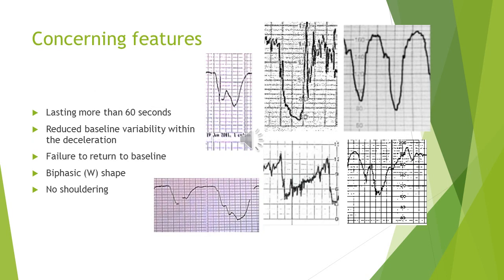We spoke about the variable deceleration, or the V shape, and we said they are either typical or atypical, or concerning and non-concerning features. So what are the concerning features? When should I worry when I have a V? Because before, the Vs are okay. The V, at most, is a non-reassuring feature, which means I don't need to do anything if other features are normal.